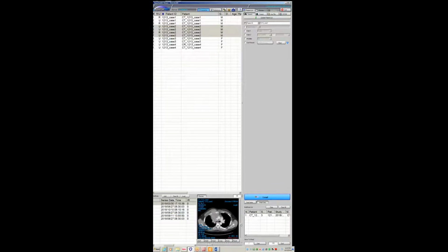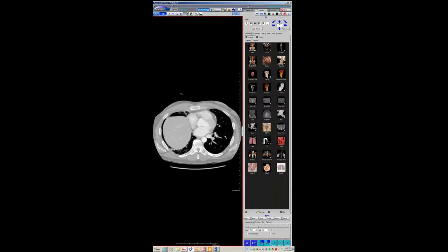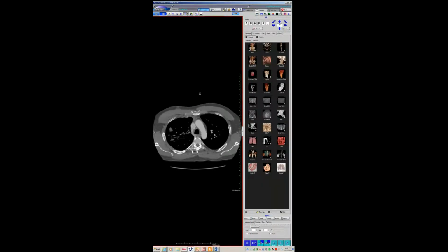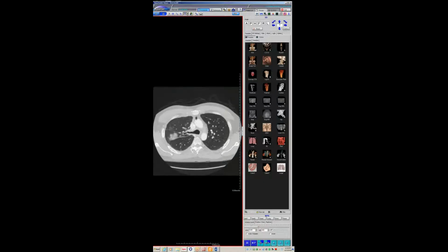Let's see, so that's tumor. Then it goes away, or nearly completely goes away. But what's not surprising is that the right superior pulmonary vein is still where it was invading through and going into the left atrium. I'm not sure if he was irradiated. I would have to check. I think he was, but he starts developing these patchy areas of consolidation, some fuzzy ground glass around it.